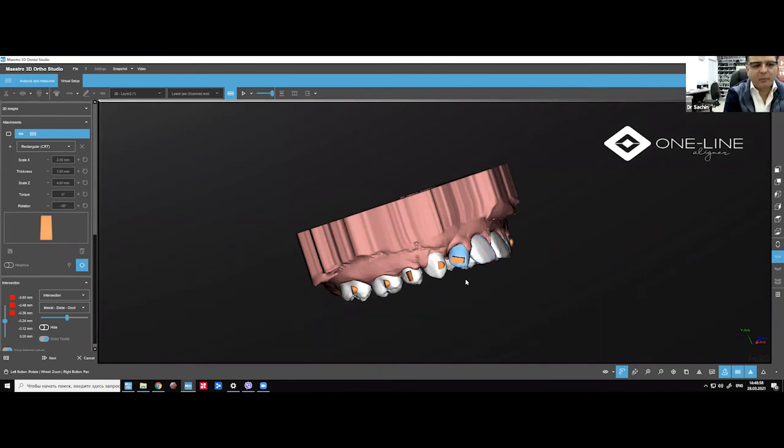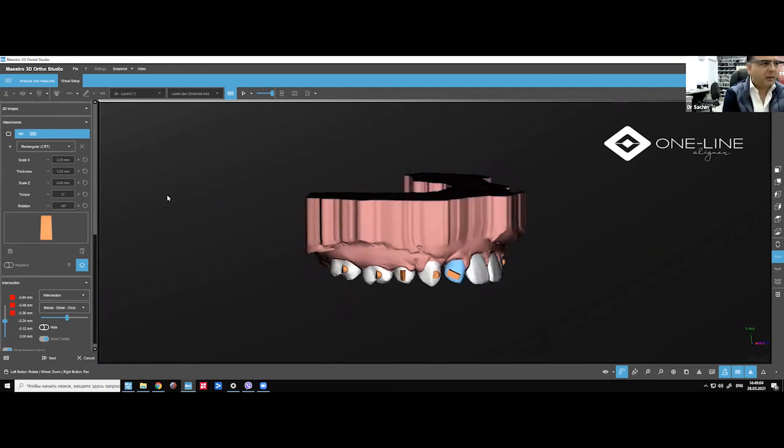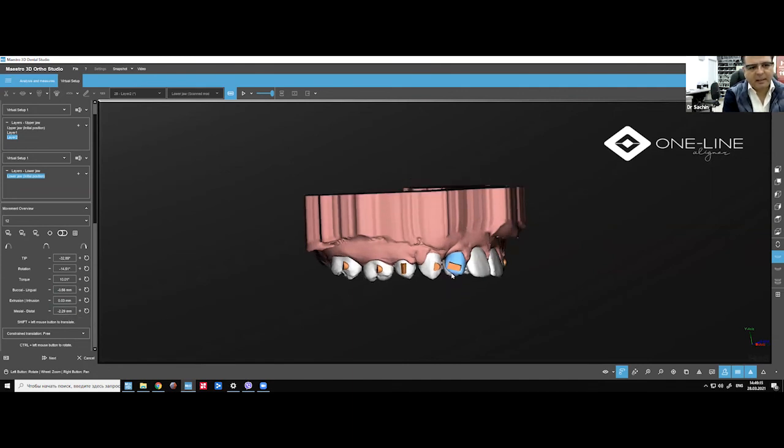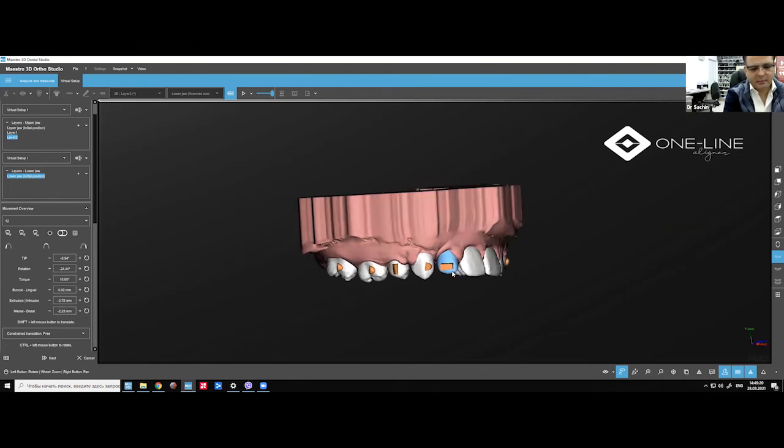You would like to keep the crown here. So here, if I make that movement, I will not move the crown if I want to move the tooth distally. So what I will do is I will remember how much is the place for the mesial distal: minus 2.29. I will keep it here. I will make a distal movement, and I will keep this place here, you see? I don't want to move the crown mesial then. I hope that makes sense. You have to make two movements together if they are in the same direction. If they go in different directions, you cannot do that. Then it will not work.